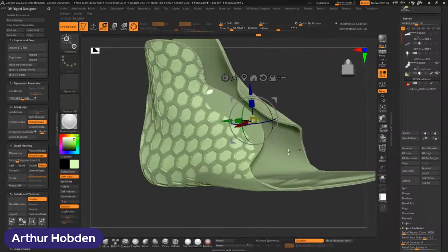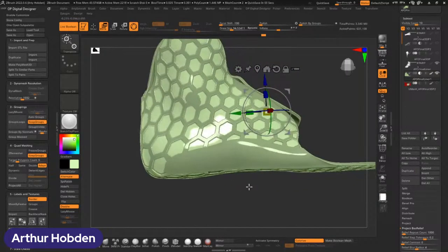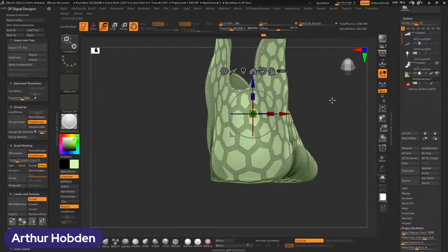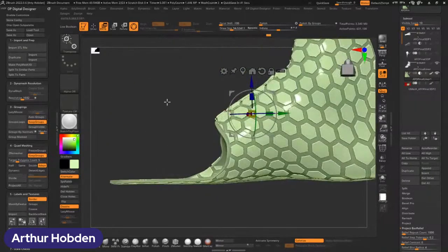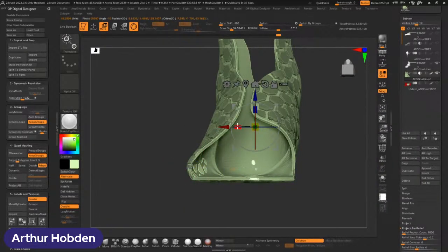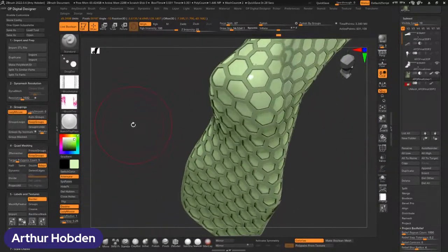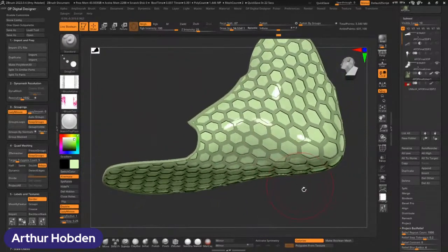And, you know, we'll have to do a bit more finessing to get this to work properly. But it's actually updating a Boolean in live, real time, to make this. So if I turn this Boolean off, you can see that this outer group here is not in the right spot. So let's bring that out a bit. Now everything's clipping. And this one here, let's give that a bit more space. So a bit of finessing here and there, but overall, very easy to make and map these kinds of textures across a very complex surface. So now this would be something that would have a lot of flexibility in it.